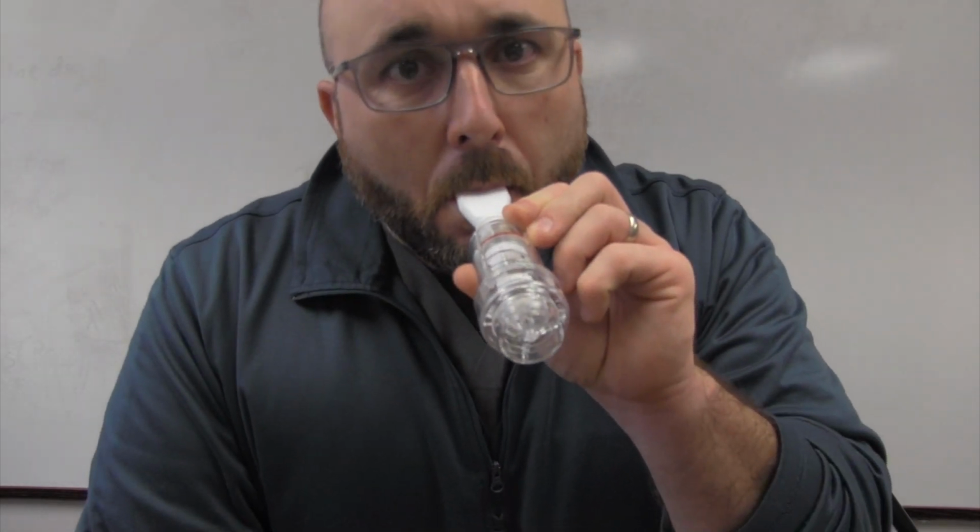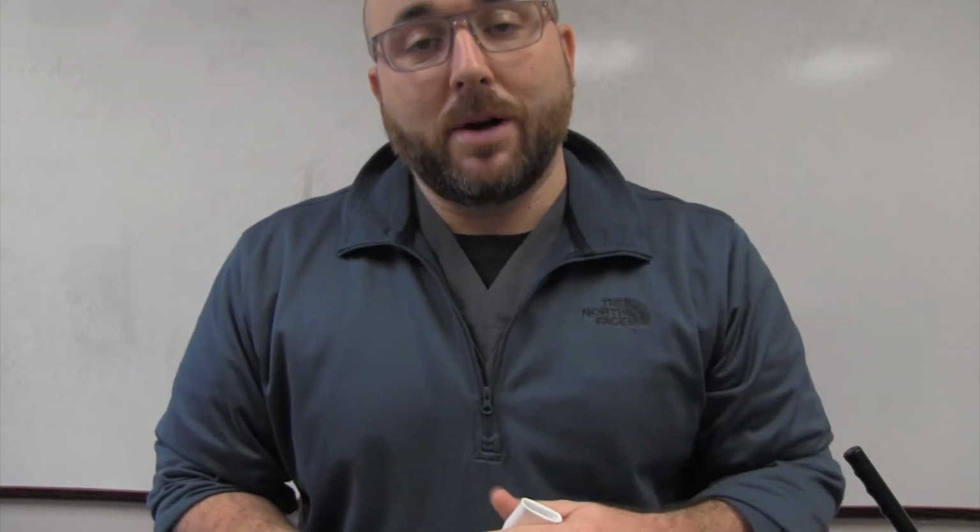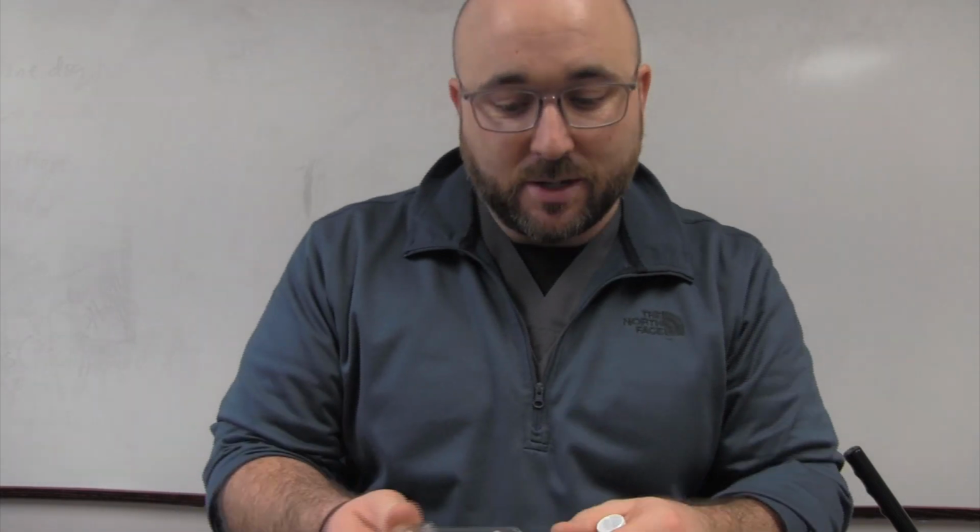And it stops there kind of at the end. So what I'm working on is my inspiratory muscles, which are those muscles that are most important to be able to get the air in. So you're going to see. Now normal breath would be like this. Now I'm pulling through this, so it's actually working my muscles, giving me resistance. It's like sucking air through a straw. So when I do that, it is going to build up my intercostal muscles and other respiratory muscles.